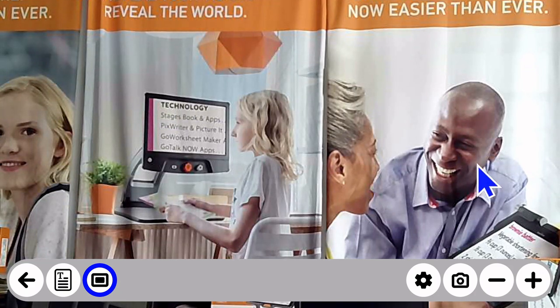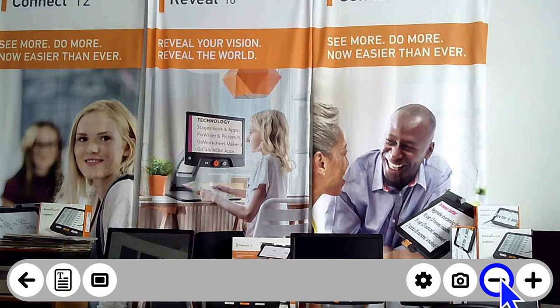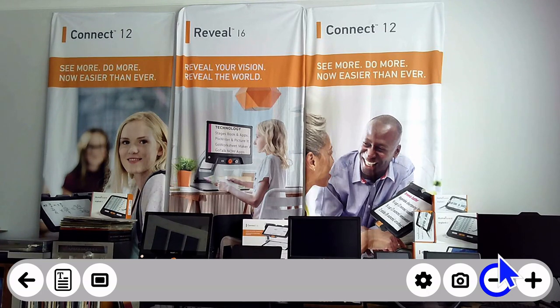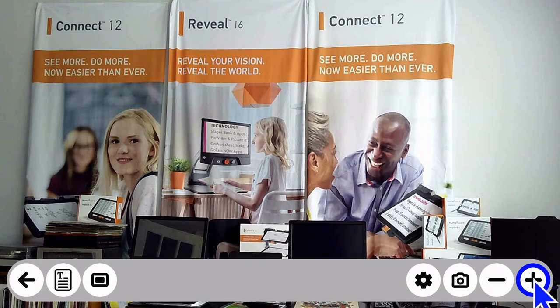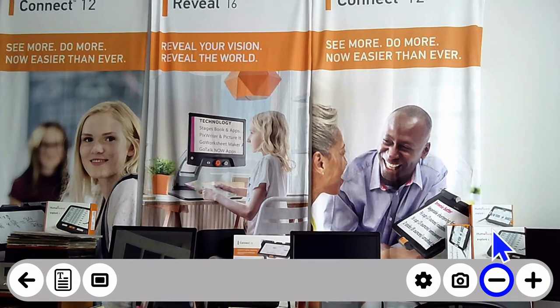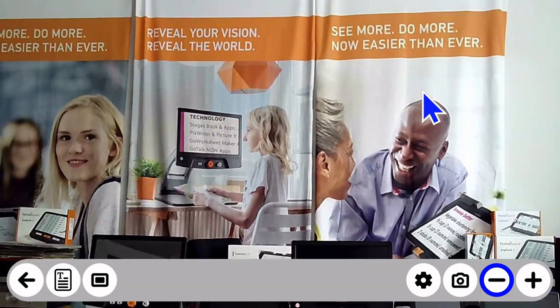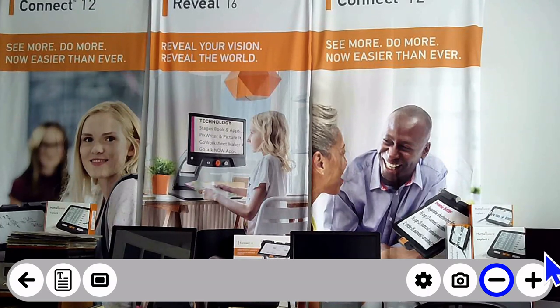And it will open up, and you can see that I have a distance camera connected right now. And I'm going in the bottom right corner of my screen and hitting that minus sign that you see there. It's bounded in a blue circle. That's the color that I've chosen for my locator. And I can zoom out, or in the lower far right, there is a plus that allows me to zoom in. Now note, I can also use touchscreen for pinch and zoom here, or if I have a mouse with a wheel, I can use the wheel on my mouse to zoom in and zoom out as well, as I'm doing right now. So that's very simply zoom in and zoom out.